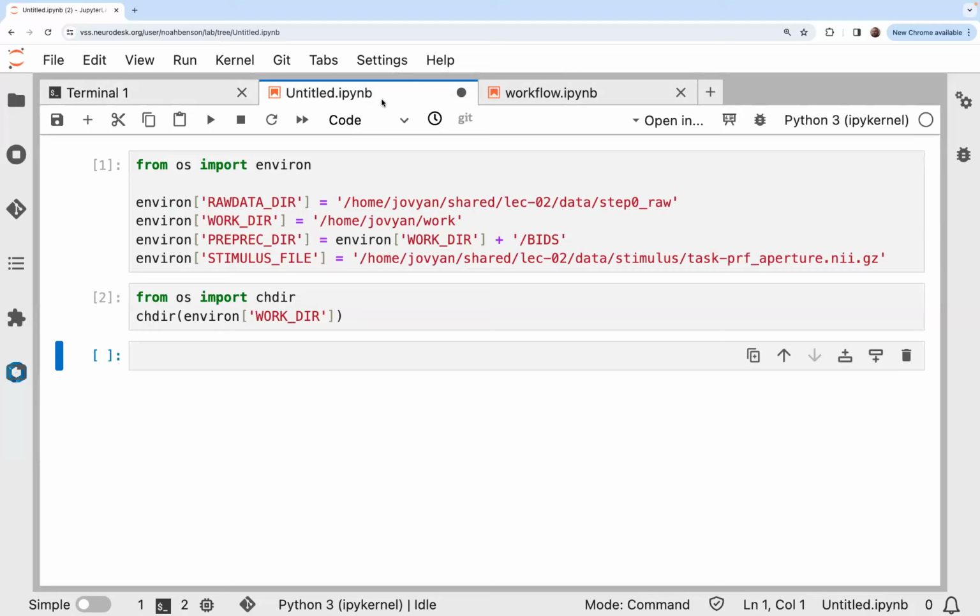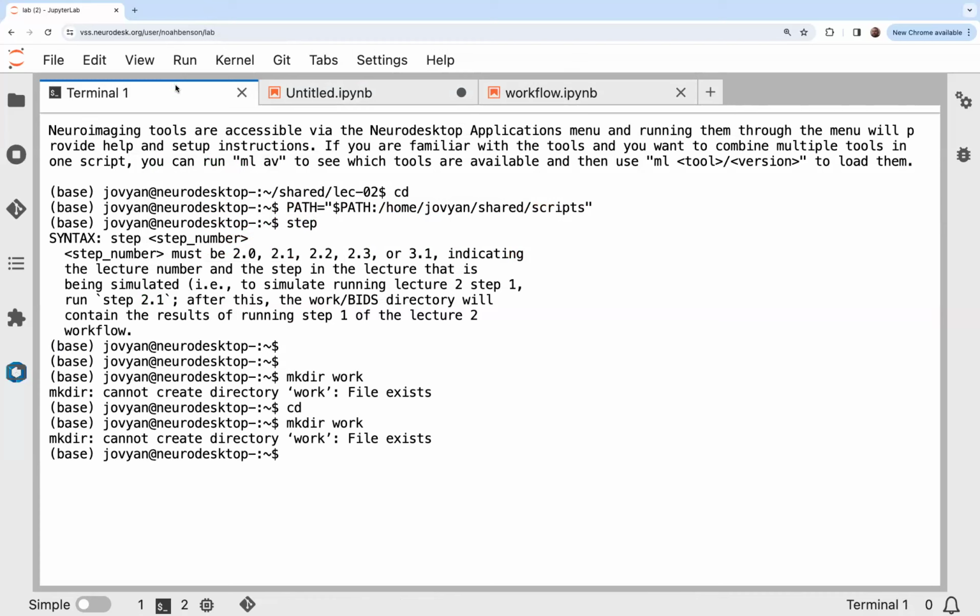mkdir command not found. Wait, and you're in a terminal like this? When you typed this path command, is it possible that you didn't include the $PATH at the front? I'm not sure why that would have happened.